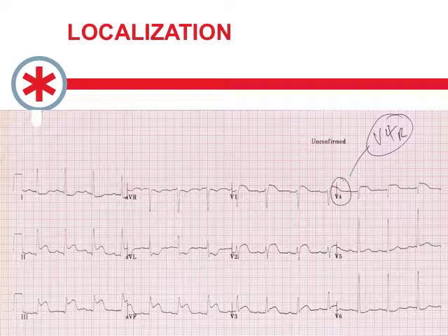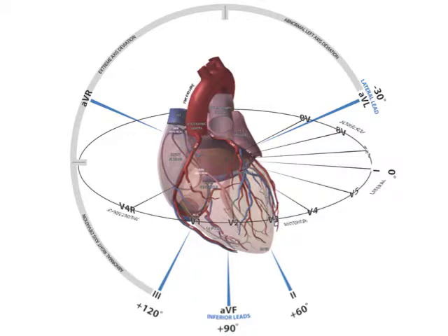So I think most of us have run across this: the patient with the big inferior, and particularly if they've got RV involvement and suddenly get hypotensive, these are the ones who need fluid therapy. Pump up their right heart side, get some fluid over so it crosses over to the left and gives them some ability to pump some volume out to the body. So just be a little wary. These are the patients who get into hypotensive trouble with your nitro, but will be very fluid responsive. And if you have a peek at this, it makes total sense. 2, 3, aVF, that's your inferior, and then V4R pointed over just to your right ventricle gives you a better look at the RV.